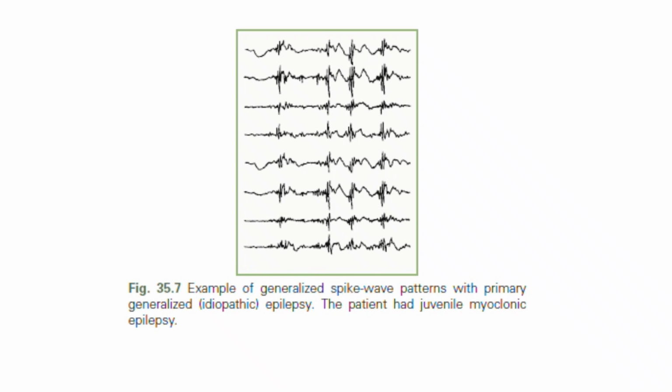The background activity is abruptly interrupted by these fast, somewhat irregular spike wave complexes, typically firing at a frequency faster than the classic 3 Hz seen in standard absence seizures, usually resting around 3.5 Hz to 6 Hz. When you see this precise run of polyspikes on a patient's routine EEG, it correlates beautifully with a clinical history of brief, involuntary morning jerks or generalized tonic-clonic seizures frequently triggered by sleep deprivation.